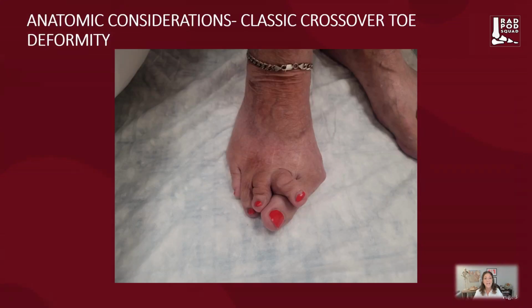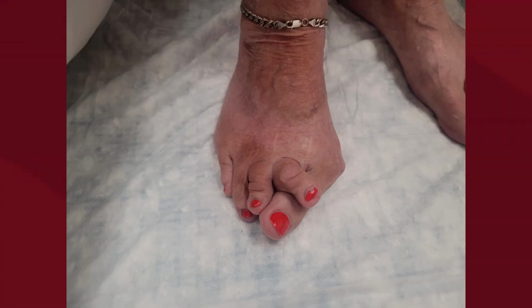So this is the type of medial toe crossover that we're looking to avoid in early plantar plate imaging and accurate diagnosis. By assessing the plantar plate at a stage earlier than the one seen here, we can prevent these gross malalignments that we can see in forefoot imaging.